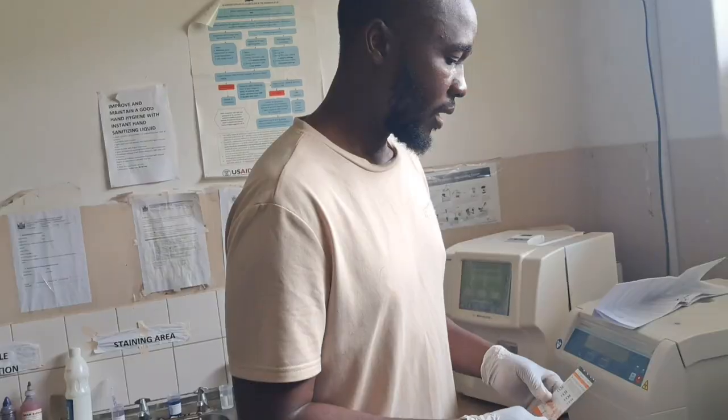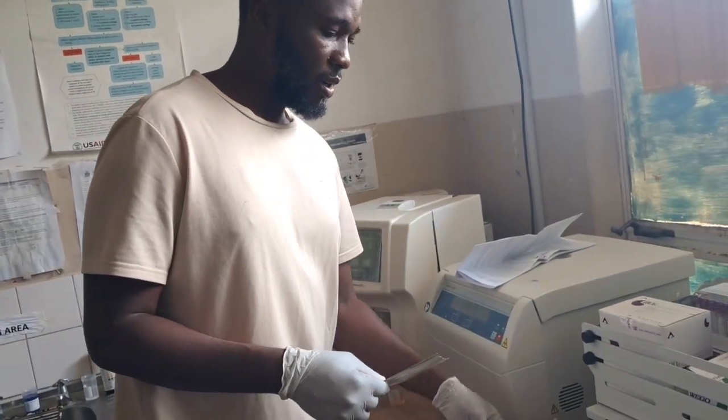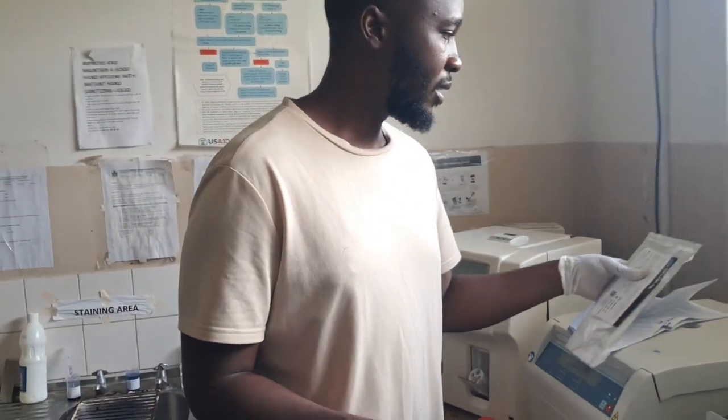We also have Mycobacterium tuberculosis. Now looking at our country and our district, we are focusing more on Mycobacterium tuberculosis. That's why it will work for this, because this is a TB endemic area. Yes. So now we can proceed to the test.